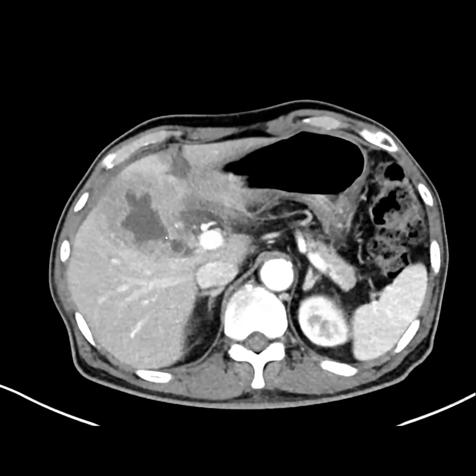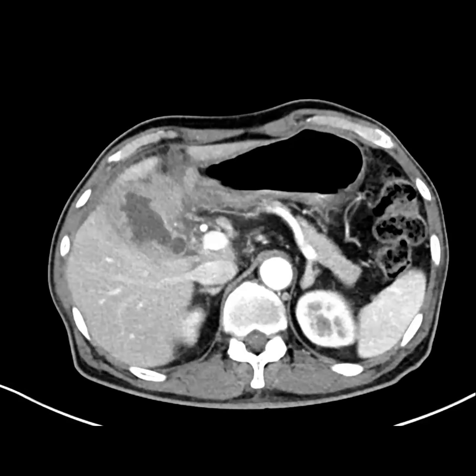So anyway, just an interesting case that mimicked a gangrenous gallbladder, but was actually a gastric cancer fistulizing or obstructing the gallbladder. Nelly was asking, if it was just cholecystitis, why does it look kind of gangrenous? That's where we think there is a possible fistula, so maybe gastric juices were going into the gallbladder. Gotcha. It looks like there's a connection and communication right here, but it's not your classic gangrenous cholecystitis, it's related to this process next to it.